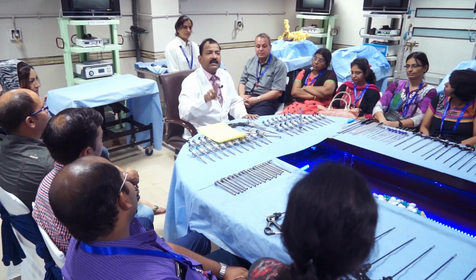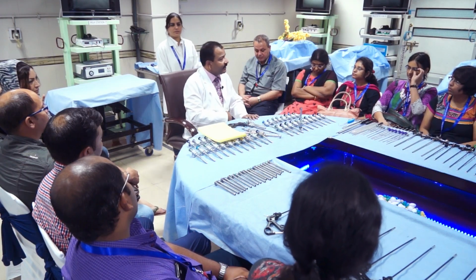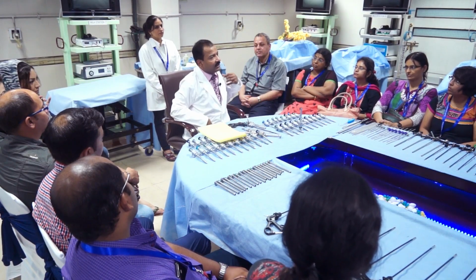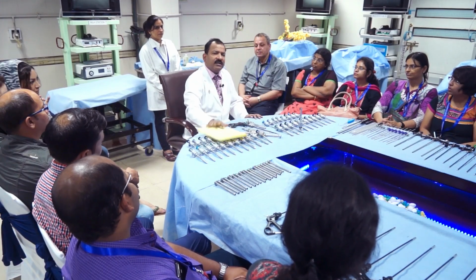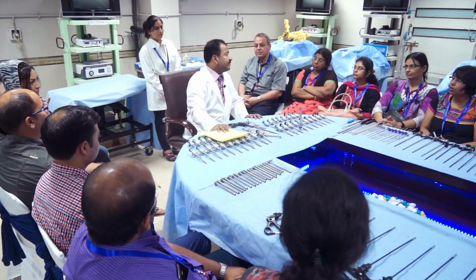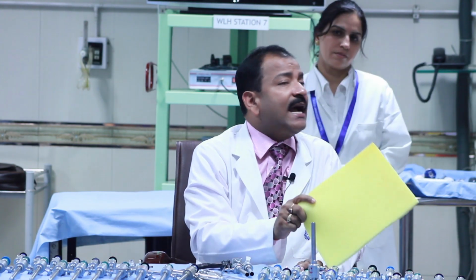Always the surgeon has to stand opposite to the pathology. If you have to do left side hernia surgery, you have to stand near the right shoulder. If right hernia, left shoulder. Gynecologists, they never do that, they always stand on the left. Even if they have to operate on a left side ovarian cyst, they stand on the left and they struggle. Another example is that the distance from the monitor should be 5 times the diagonal length of the monitor screen.